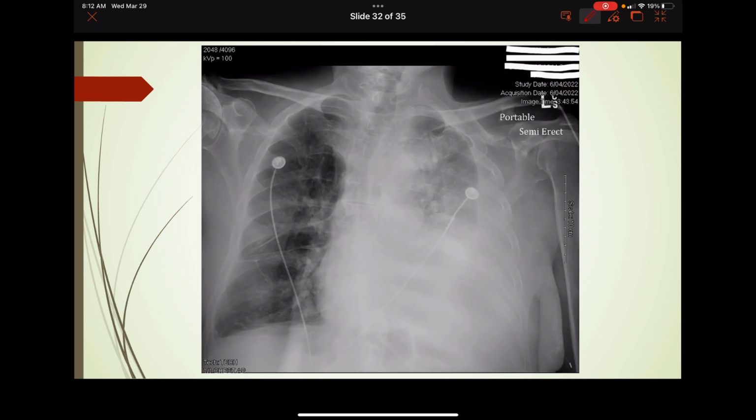And a few pleural effusions. This is a patient of mine, I can tell. Came in with a big left-sided pleural effusion, small right side. So here's trachea coming down here. Looks like this is carina. Trachea is clear. B for bones, no fractures. Cardiac silhouette, you can see the right. Can't see the left side of the heart because of that big pleural effusion. Diaphragms, looks like it's a small right pleural effusion. You see how flat that is. And a big, massive left pleural effusion.